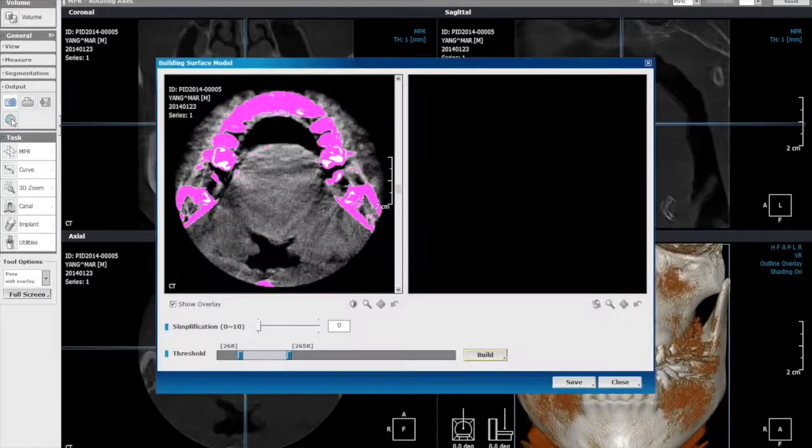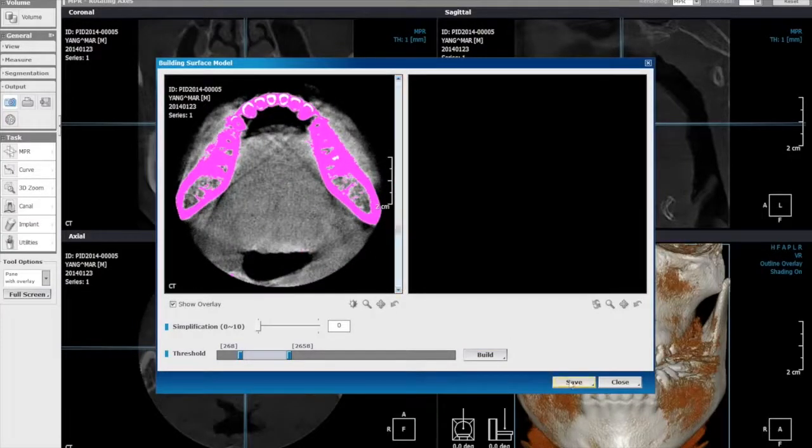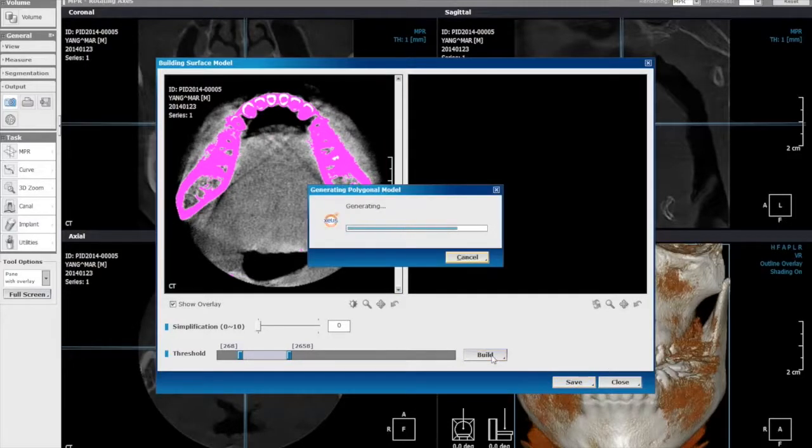Right of that is Save Surface option. This function enables the volume data which makes up the 3D image to form a mesh data, or often called STL, that can be uploaded to other 3D viewers.